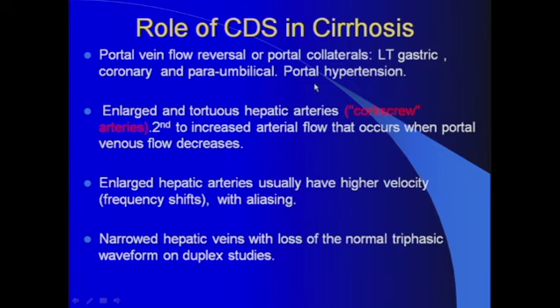Now, it's very important to keep in mind that in a good percentage of patients, without advanced grayscale imaging, they may start to show these findings of portal hypertension, which is really important to include your color Doppler evaluation in every right upper quadrant ultrasound in patients known to have chronic liver disease.